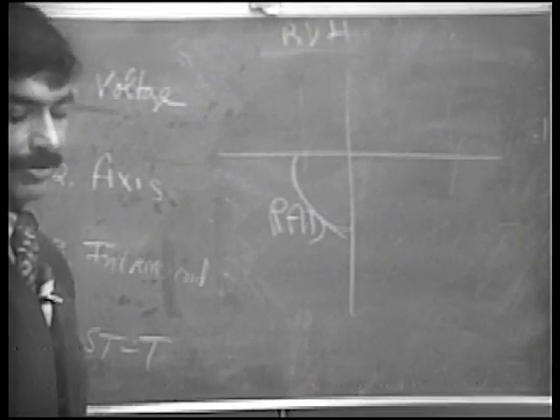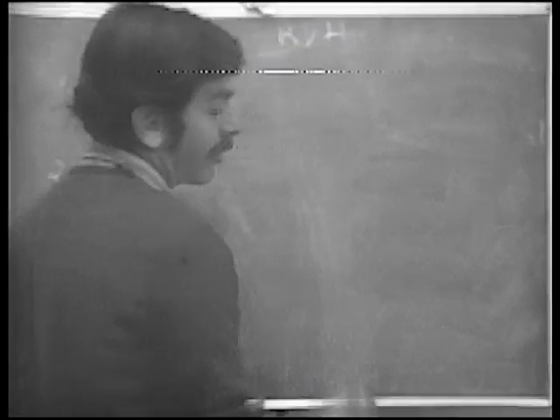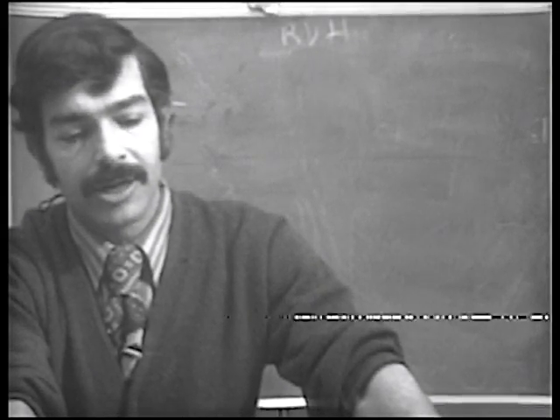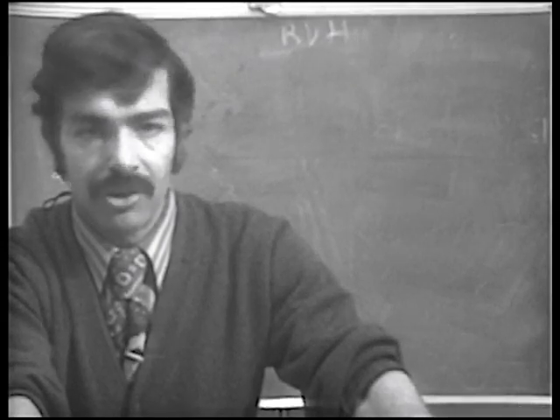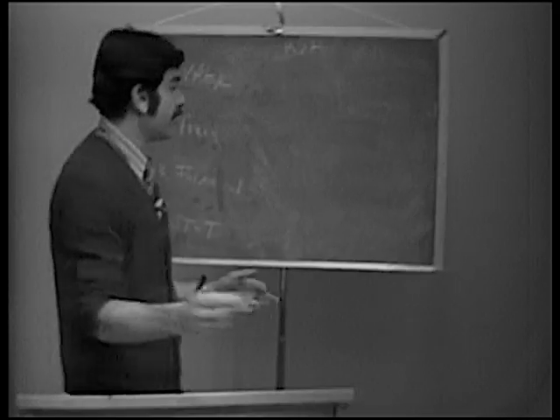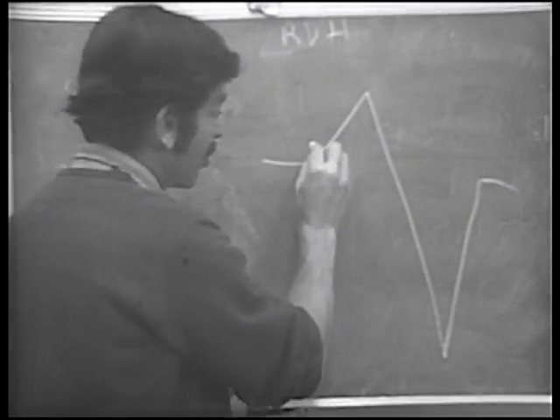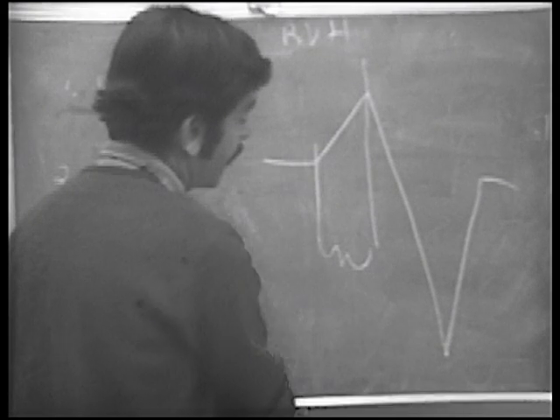Now, intrinsicoid deflection. In left ventricular hypertrophy, we looked for the intrinsicoid deflection in the left ventricular lead, which was V6. In right ventricular hypertrophy, you want to look at a right ventricular lead. So what's a good right ventricular lead that we use? It's V1, okay? So we look at the intrinsicoid deflection in lead V1, and V1 expanded normally looks something like that. The intrinsicoid deflection again goes from the onset of the QRS to the peak of the R wave. So this would be the intrinsicoid deflection.